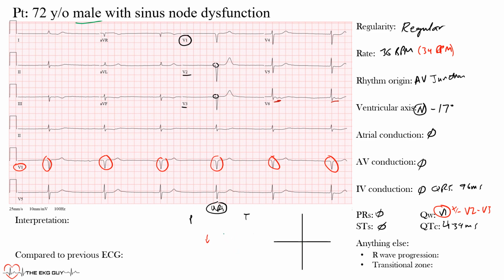Now normally not until around 500 milliseconds do we get a little concerned, and sometimes the machine will give us an alert, if we're in the hospital, of a patient that is having a more prolonged QTC interval, because this could put patients at risk for torsades, which could be a life-threatening arrhythmia, or ventricular arrhythmias. All right, so let's move on to the last few things.